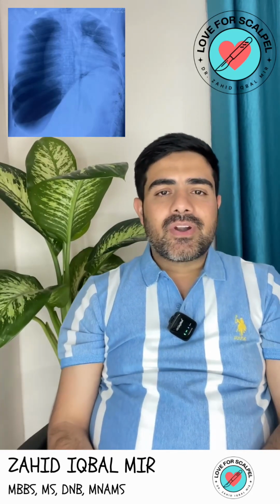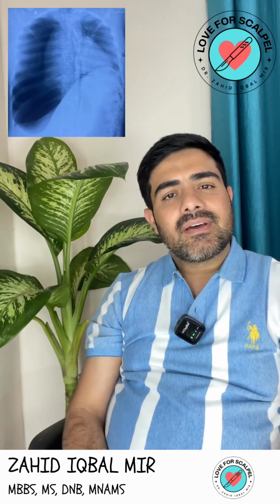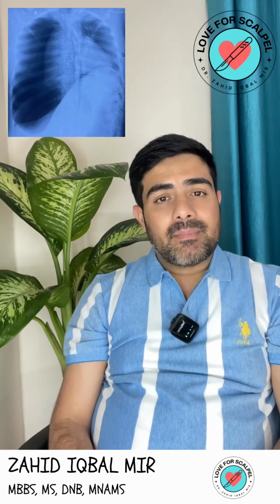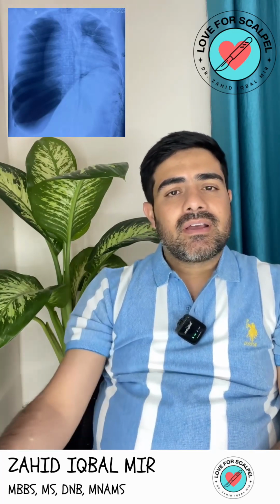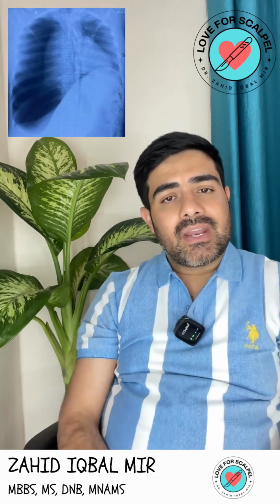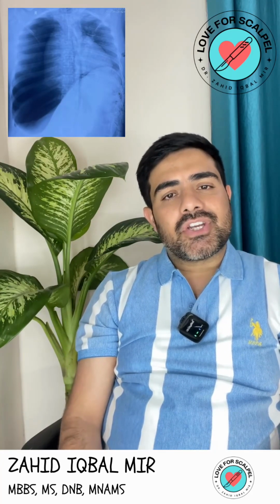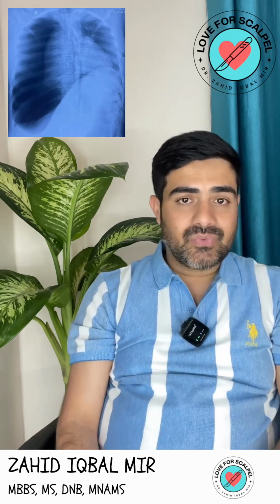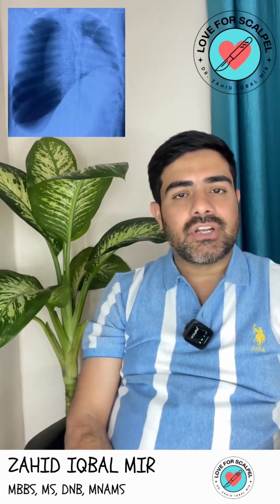So in X-ray 1, what we can see, there is a huge pneumothorax on the right side, and due to which there is collapse of right lung. Besides, there is deviation of mediastinum towards the left side. We can appreciate tracheal deviation to the left side, and there is deviation or displacement of diaphragm downwards on the right side, which is suggestive of huge pneumothorax, that is most likely a tension pneumothorax.